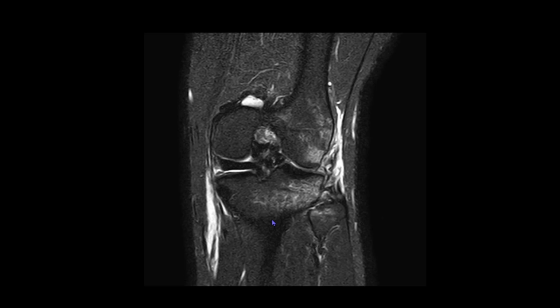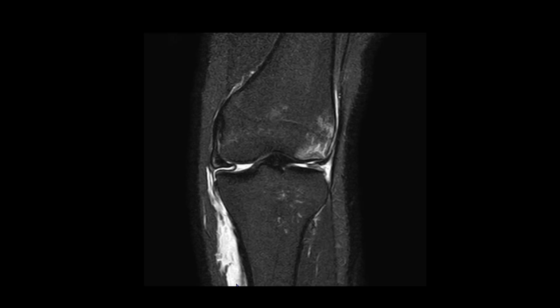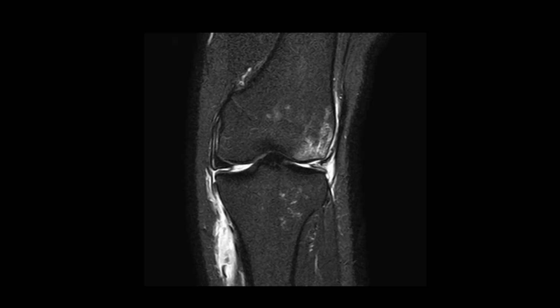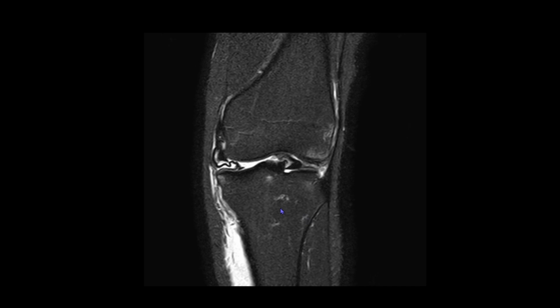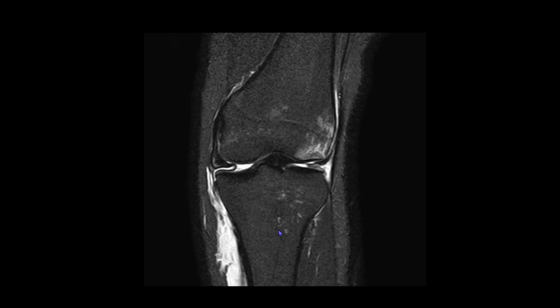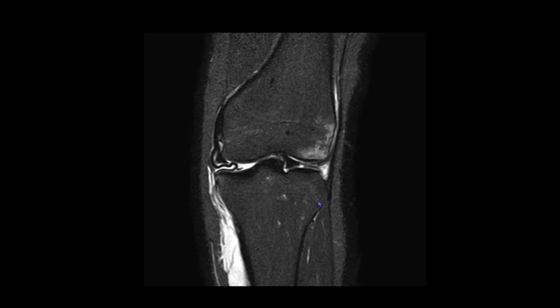However, on tracing it towards the tibial aspect, we see that there is a large fluid collection or a hematoma at the expected site of tibial attachment, from where the MCL appears to have avulsed, and it seems to have been retracted proximally and is seen lying in the medial aspect of the knee joint in between the medial femoral condyle and the tibial plateau. So this is a complete avulsion of the medial collateral ligament from the tibial aspect, and the torn fragment is seen insinuating within the joint space.